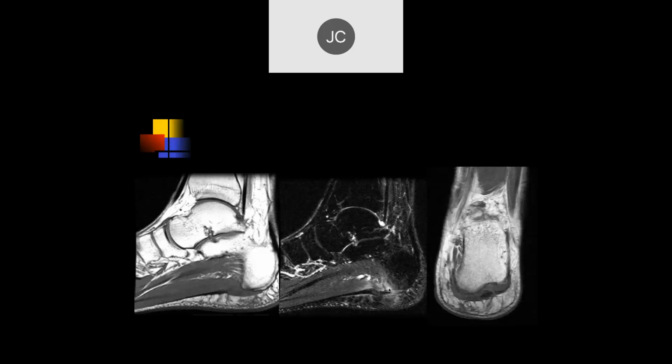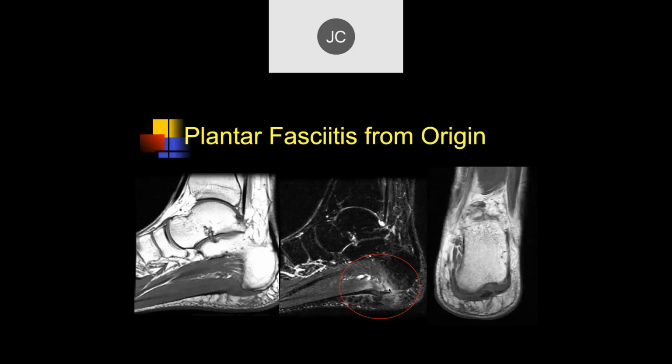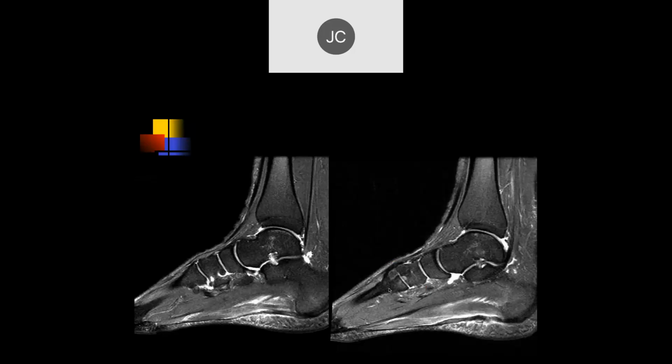Well, I don't know. We do a lot of MR scans looking for heel pain in adults and in older individuals, and the most common causes are these partial or full thickness tears of the plantar fascia origin. So we see a lot of these in clinical practice. Okay. I had a difficult time buying what Campbell said.